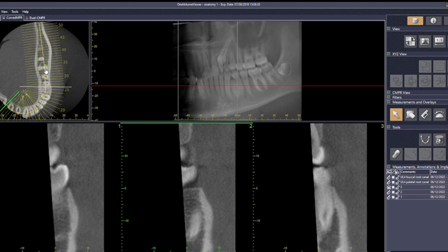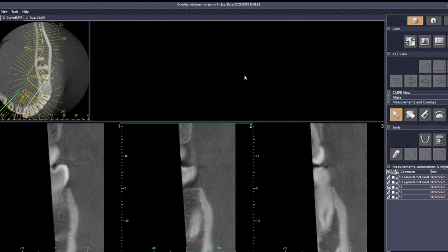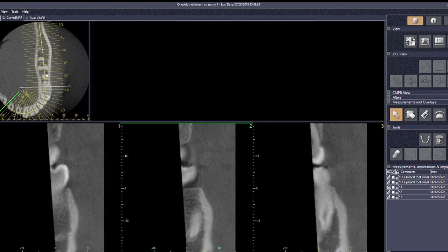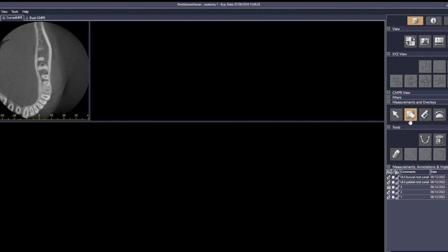If you're doing this, you get something wrong, you can change the points here. So see, I'm modifying the point. So let's say you get it wrong and you put it here and you say, oh, this doesn't look right here. You can grab the little red dot that you put and move it. If you got things totally wrong, you can erase it. Go back to draw it again. Click, move, click, move, click, move, click, move.